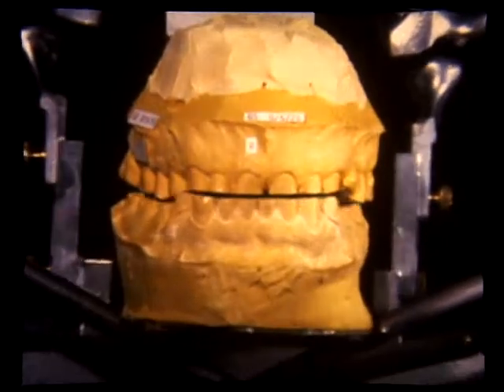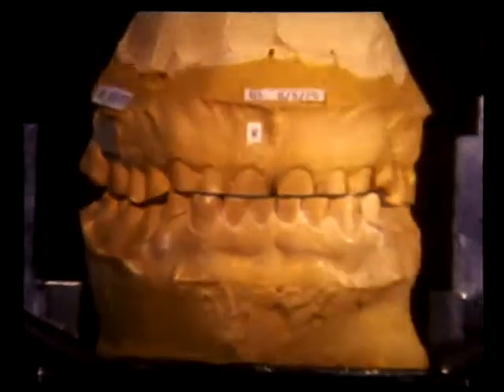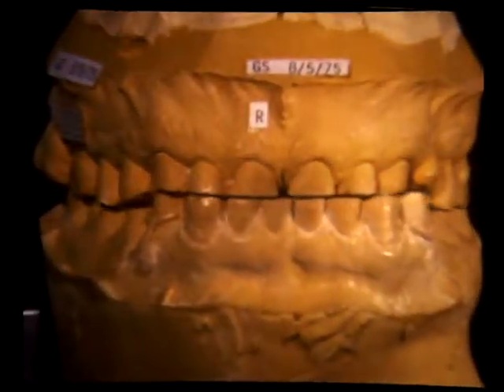In another display, a mandible is mounted in the replicator using the coordinates of this subject with a chewing series superimposed over it. The mandible in the background display is being moved by the stepping motors, which are being driven by the subject's recorded chewing data, which is the same method used to show the movement of the subject's casts. A 2 millimeter square grid helps to understand the magnitude of the sliding of the teeth as they pass through the intercuspal position without stopping.